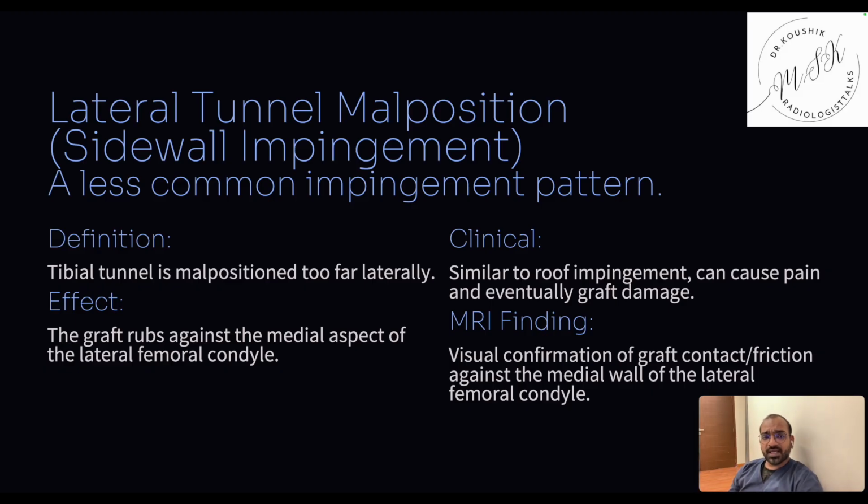There is one more thing called lateral tunnel malpositioning. That is where the tibial tunnel is more laterally placed, usually far laterally placed. That also can cause impingement, so graft impingement can happen.